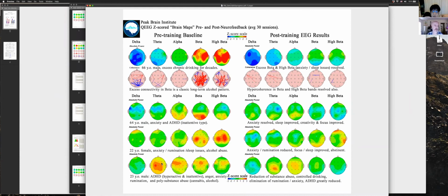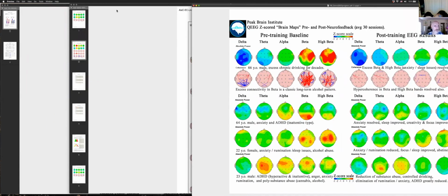Okay, here's hypervigilance: eyes are closed, the brain's like scanning, can't let go. Here's a guy who'd been drinking for 25 years, in the absence of alcohol. This is him 45 days sober. He couldn't stop moving and talking, couldn't fall asleep without a drink ever. He needed major medication to fall asleep because of 25 years of alcohol dependence. In the absence of alcohol, his brain was lit up and buzzy. Couldn't make sleep waves. So you have some of the same lack of delta that he had.